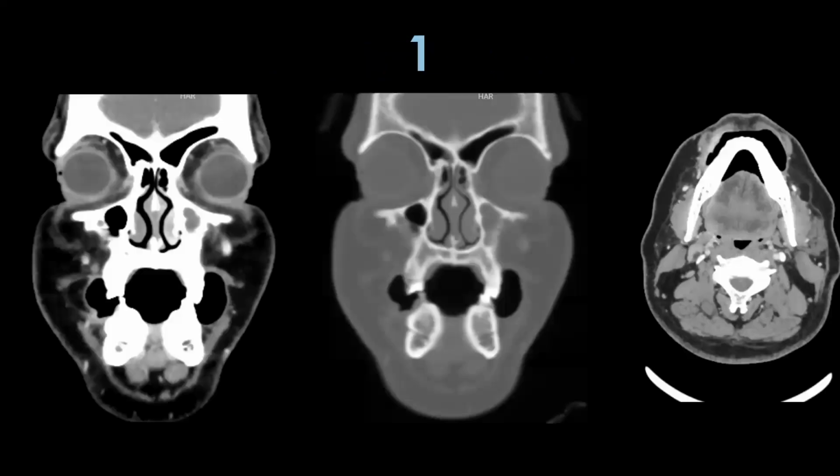Now we'll see certain cases, some CT cases and some MRI cases. We'll start off with straightforward cases and then build up on little complicated ones. This is the first. I've kept a small quiz towards the end for the fellows. So if they get an idea right now, then they might be able to do the quiz a little better.